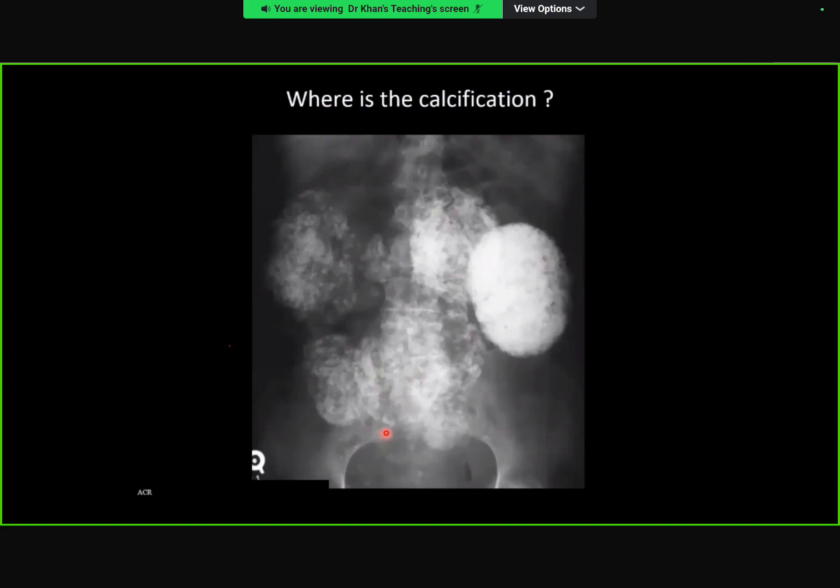Large gut. Anything else? This patient is quite, clinically speaking, quite good. Where else could it be? Think gynae. Okay, so it can be pelvic, like fibroids, calcified fibroids. Please remember that fibroids, the uterus can go all the way up to the diaphragm and they can be huge and they can calcify. So this is the visceral type of calcification.